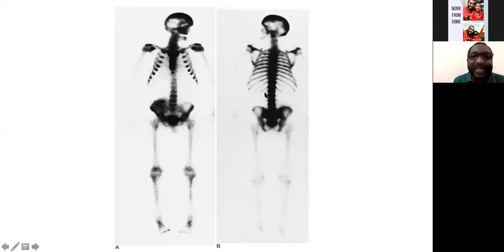But in this patient, there is an absent kidney. And another thing that points to this is that if you look at this side, the part of the right iliac fossa, you will see an increased uptake. So that tells you that this patient has a renal disease. This patient had a renal transplant, all right? And this is typical in patients. This is a typical appearance of a renal osteodystrophy.